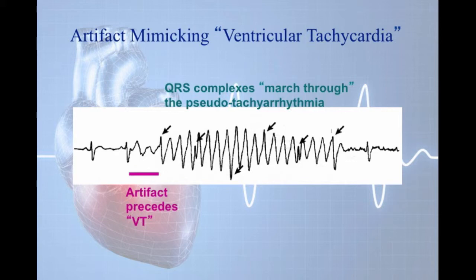If this rhythm shows up out of the blue, your patient is maybe young and they don't meet the general criteria of the patient you would normally think is in this rhythm, or they're conscious, make sure you look at your leads and see if there's any additional artifact, or you're bouncing down the road. They may be nervous, or tapping their leads. There are a lot of different reasons that you would have this type of artifact. Make sure you check your patient.